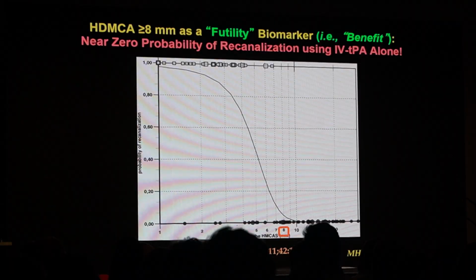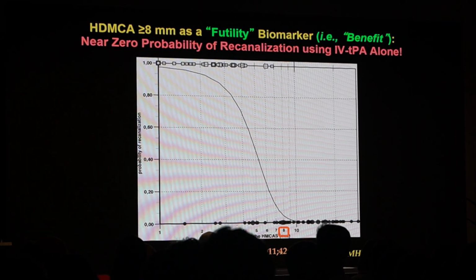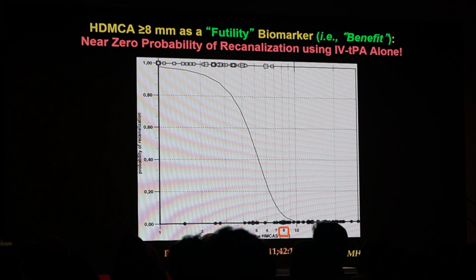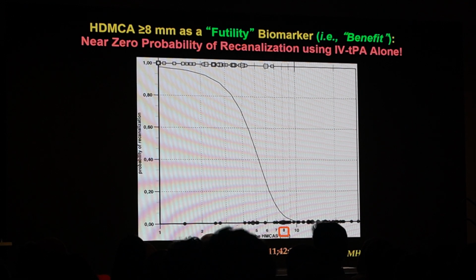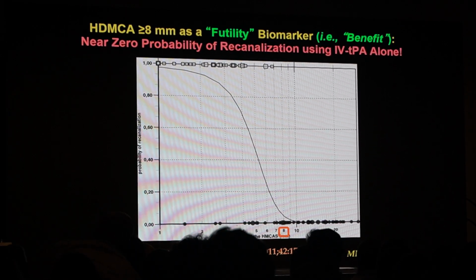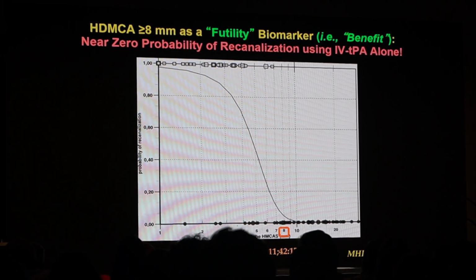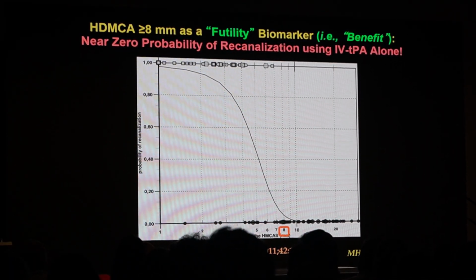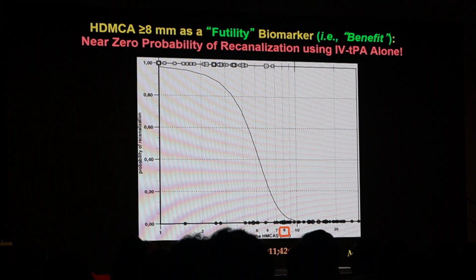And before we had CTA to look for a large vessel occlusion to decide who was a candidate for catheter endovascular thrombectomy, EVT, we would look at the length of the dense vessel. And this is a very famous paper by Riedel from Europe. And this is what, before CTA was routine, everyone used to decide who to do EVT on.